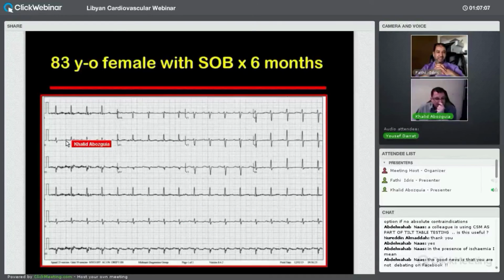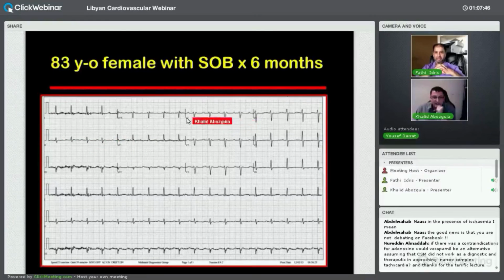So you remember when you showed us this ECG, I think Yusuf mentioned that lead 2 didn't look quite normal. See that there? Right. There, then there. So it's easier retrospectively. But I think the advantage is not just whether it is buried; it's actually the morphology. If it was a flutter, whether it is left, whether it's AT or not, whether it is normal activation or not. V1, I think they are both good, but if I have to choose one for P wave morphology, I will still stick to lead 2. But in this case, I'll be honest with you, it's very tricky. When you see that ECG, you think, oh, this is likely to be sinus.